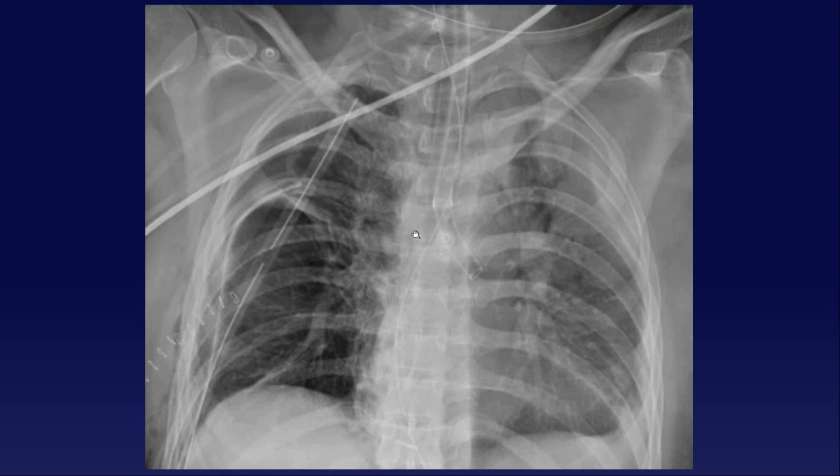The right upper lobe bronchus comes off right about here. And so you really can't get good purchase in here to isolate the lungs. The left main stem is a lot longer, so that's why they stick one of the lumens into the left main stem, inflate a little balloon, isolate it, and then ventilate the left lung through this and the right lung through this one. Okay, so that's why they have this configuration for dual lumen ET tubes.